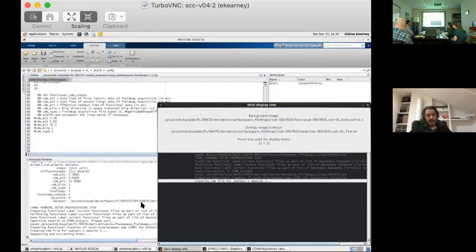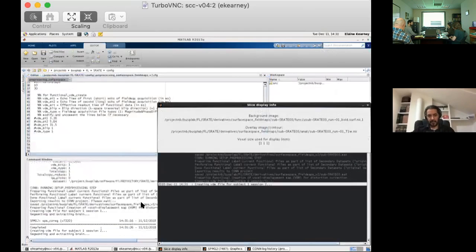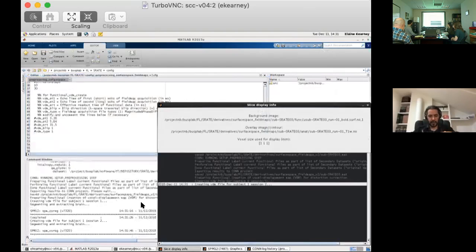Yeah, there is a big portion of the problem in some of these areas, like the most frontal pole type of areas and inferior temporal, also anterior, where there is a lot of signal dropout, and basically nothing can be done about it, other than changing the phase encode direction to produce those effects in different places. But there's some level of distortion correction, at least spatial distortion, like the spatial warping on these regions that appear to be pretty much close to where the signal dropout happens.